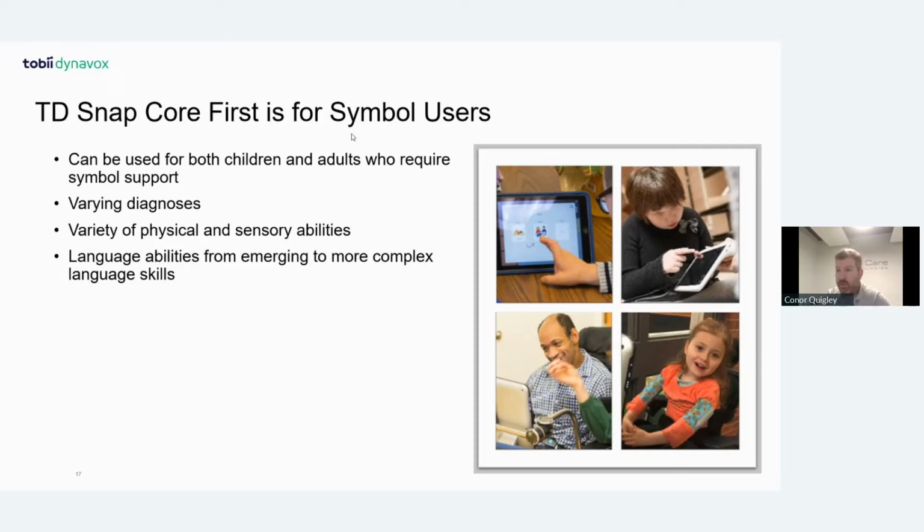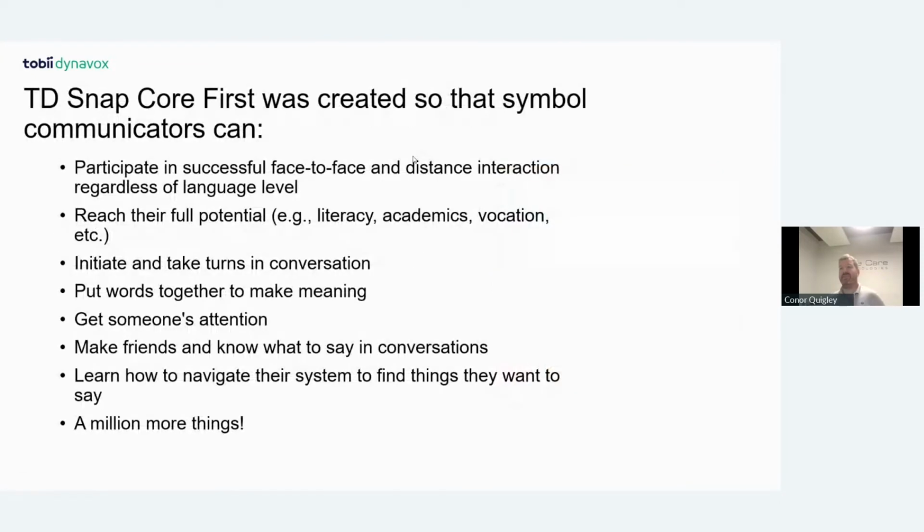So if you work with people with various different disabilities and the hardware might result in an eye gaze device, which sometimes tend to be on Windows devices, it makes no difference. Your skills will transfer across the board. I hope I put that in a way that's not confusing, but if you have any questions, let me know.